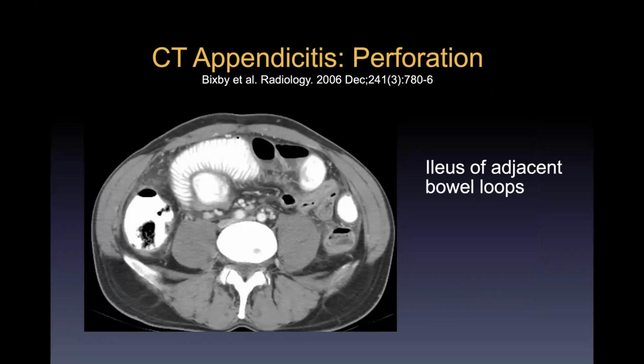Now, there are some other signs of perforation that I think are less well known, and rightfully so because they are less definitive, but they are things you want to note when you do see them. These are signs where the patient might have perforated, they might not have perforated, they just indicate severe inflammation. So in these instances, it's not "the patient is perforated, don't bother to go to the OR, stick a drain in the abscess." These are cases where you're like, you know, this patient looks really sick, it's severe, go to the OR quickly and get that appendix out.